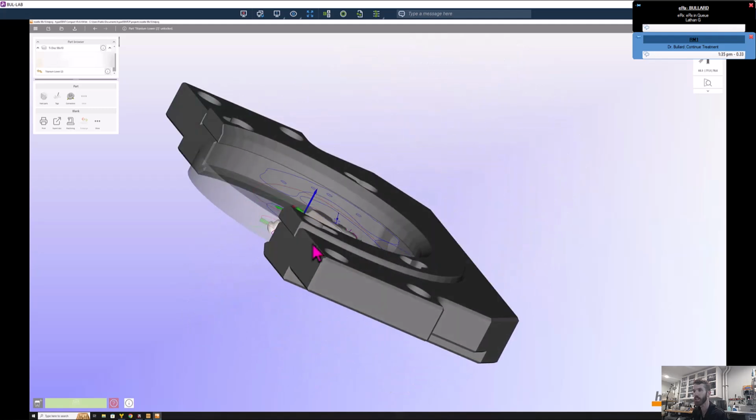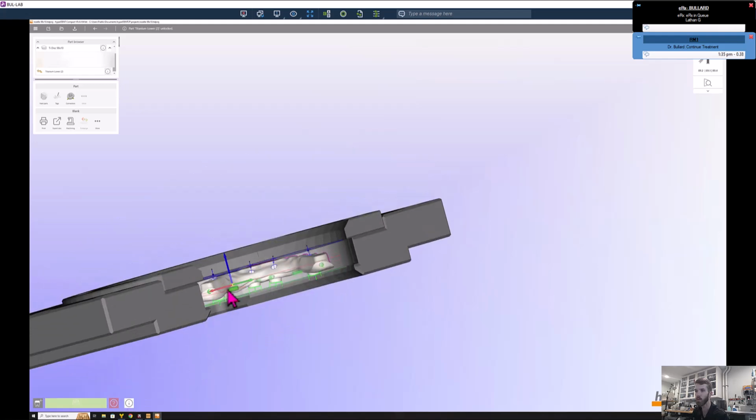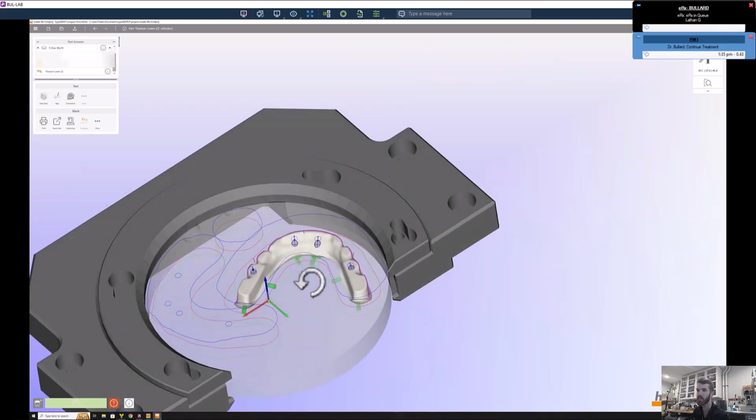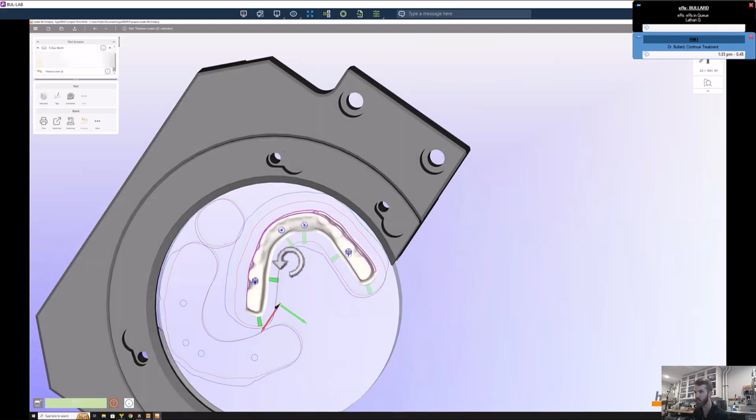We also place sprues, one on each heel and then one at each implant site along the lingual and below the margin. The idea here is to have no sprues on the area that is going to be cemented to.